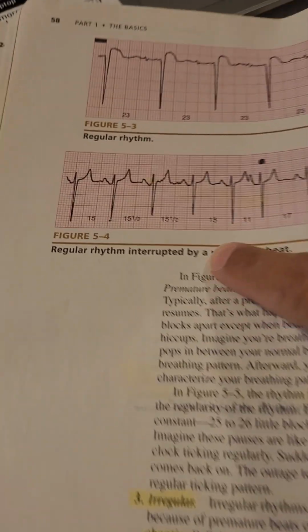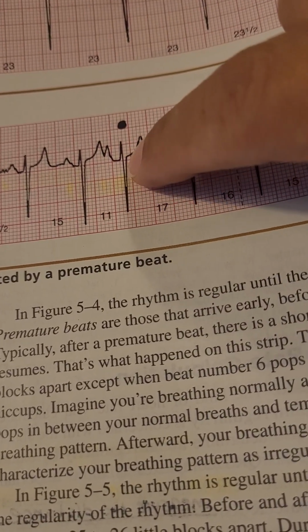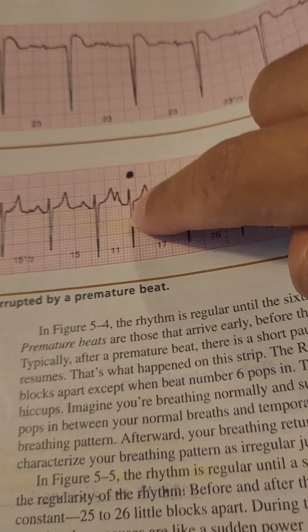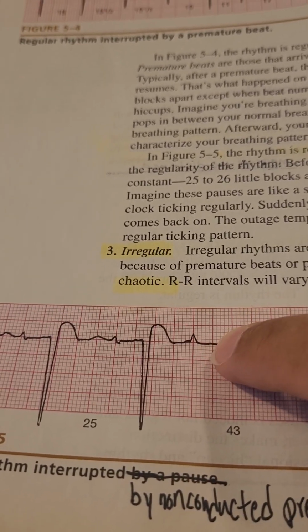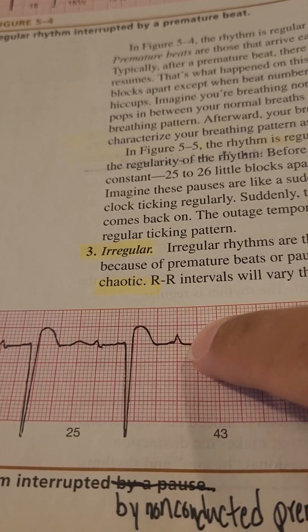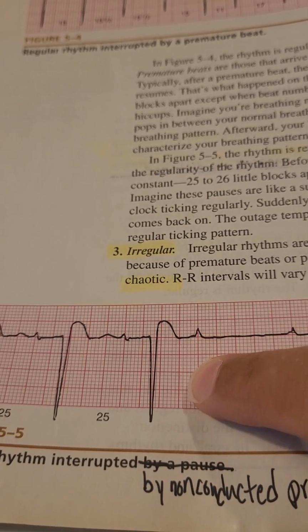It's like a premature beat, except there's not a QRS. I guess it's like a premature baby. But this one, it didn't. It's kind of, I probably shouldn't be using that word, but it's like it didn't develop right or something like that.